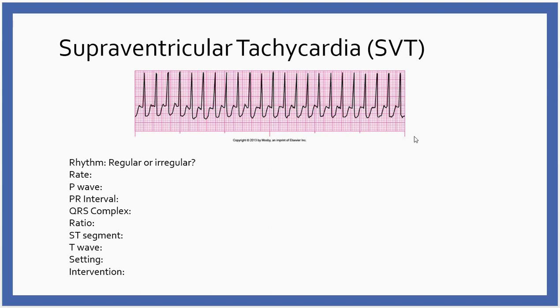How do you suppose your patient feels? Not so great, because the rate is fast, but I'm not filling the ventricles, so my cardiac output is in the tank. Chances are good your patient is going to be very hypotensive and very unhappy. You still need to assess your patient. So the rate is very fast.